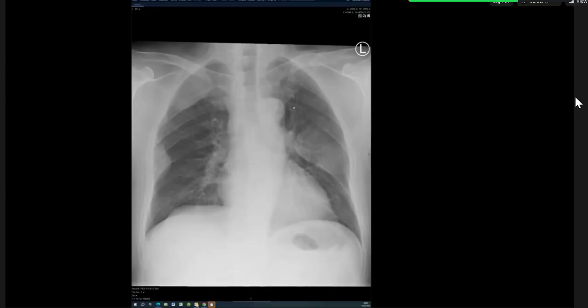Why the interest in mesothelioma? If I say the patient has no asbestos exposure and they are 35 years old? Well, the reason is when it goes into the medial part of the mediastinum, the paramediastinal lesion, and the lobulated appearance with the destructive bone changes, that would be my primary differential. However, this can also be a primary bone tumor that is invading the bones.